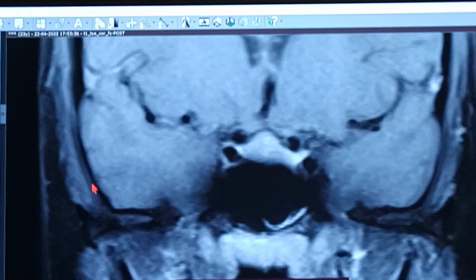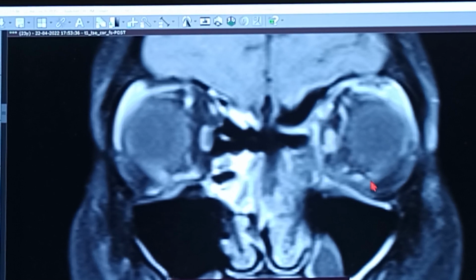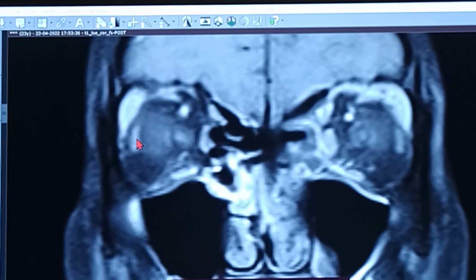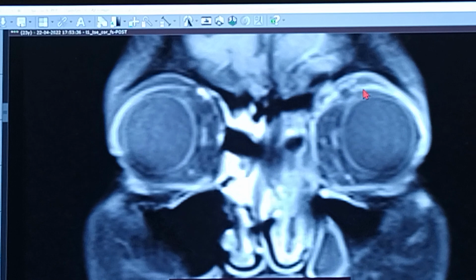Now we all know that, if I can show you the ophthalmic muscles, this is a medial rectus, that is a superior oblique. Now the SO4, that is the trochlear nerve, and this is the lateral rectus over here. This is LR6, which is the abducens nerve. The oculomotor nerve has got two divisions: the superior division and the inferior division. The superior division supplies the LPS, that is the levator palpebrae superioris, which is roughly over here in the most anterior part of the eyelid.